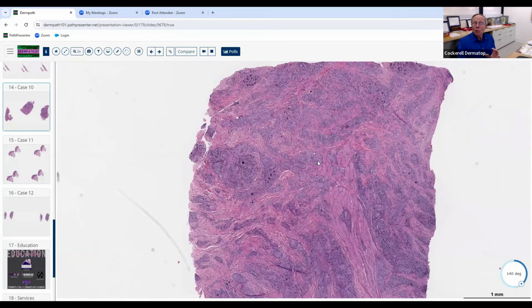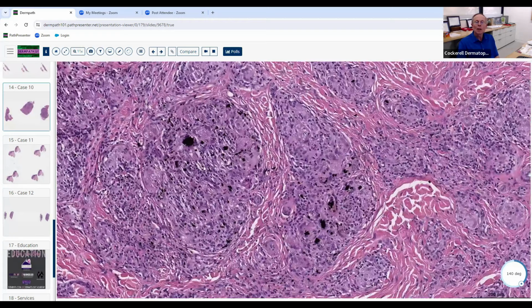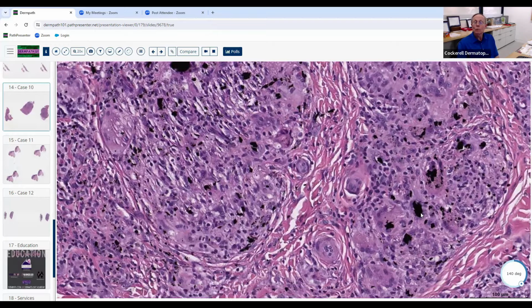You get certain foreign body granulomatous reactions that are sarcoidal in nature. Some of the metallic substances like beryllium, zirconium, those give you sarcoidal granulomatous dermatitis patterns. Silica, patients that get into car wrecks and get a piece of glass in their skin, can develop a sarcoidal granulomatous dermatitis. And then this situation. So you can see that there's this dark black or brown material, and a lot of it looks really jet black, which makes you think of carbon.